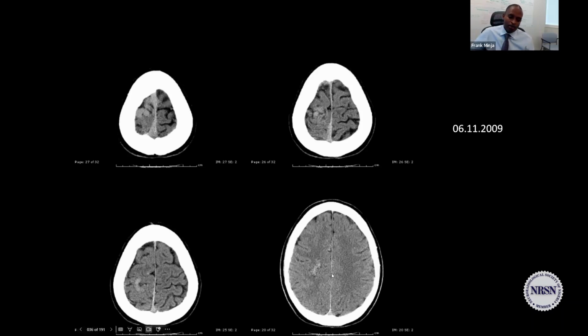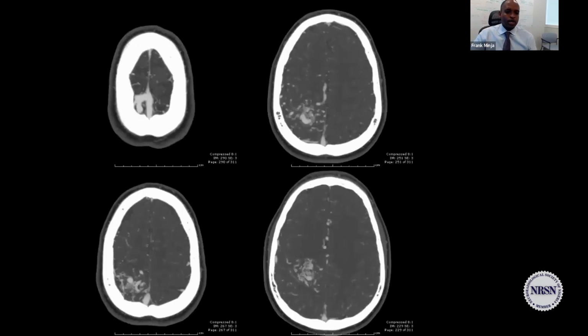And then on the parenchyma side, you have a little bit of hyperdensity, maybe calcification. Okay, calcification, that's pointed toward a vascular lesion, right? What's the next step? You have to do a vascular study. That will be a CT angiogram or an MR angiogram or an MR with contrast. And when you do that, voila, it becomes very, very obvious that serpiginous thing was a giant draining vein going back to the superior sagittal sinus.